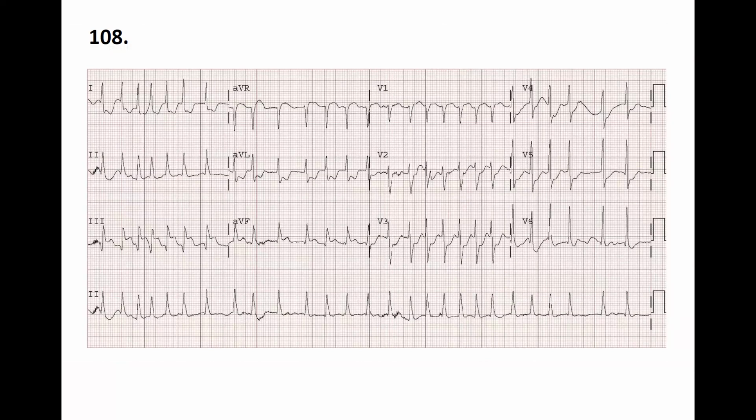Then the lead 2 or lead 1, we're going to look at lead 1. It's mainly positive. And look at the AVF. Okay, so the axis is going to be between 0 and plus 90 degrees. Normal axis. The positive leads will be lead 1, 2, 3, and AVF, and only AVR will be negative, strongly negative. But one thing: lead 1 is positive and AVF positive is between 0 and 90.